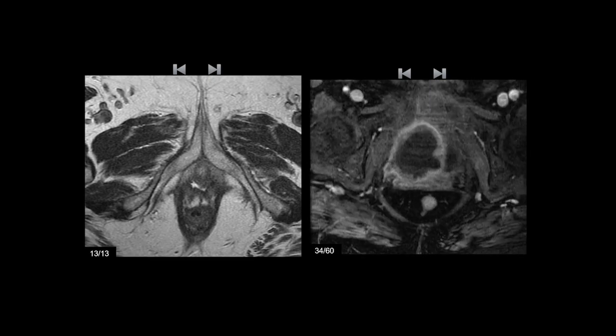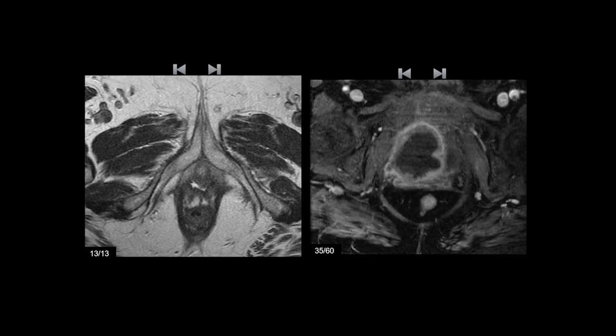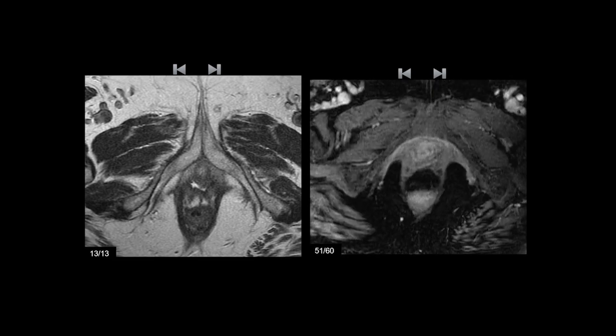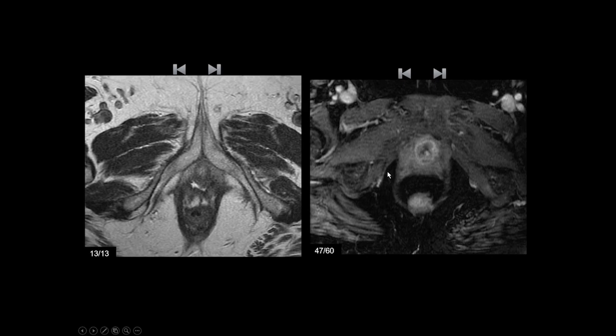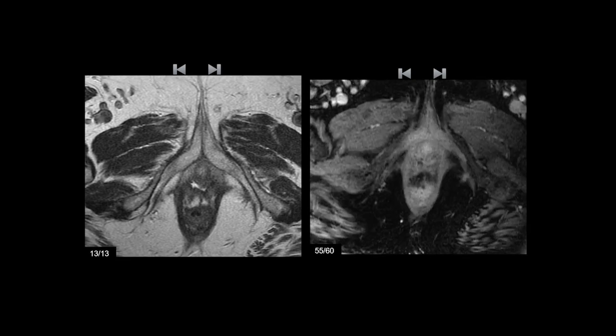They did a cystoscopy, and on cystoscopy, all they could find were bladder clots. The bladder was irrigated, reassessed, and again, no lesion was found. Chronic inflammatory, granulomatous inflammatory cells were obtained from the biopsy specimens that were taken. So what is this? This is a severe reaction in a patient who had undergone a procedure where the patient had a vaginal mesh placed along with a sling procedure performed for incontinence.